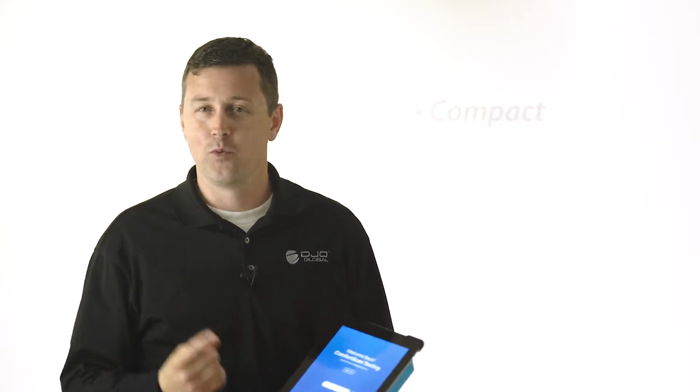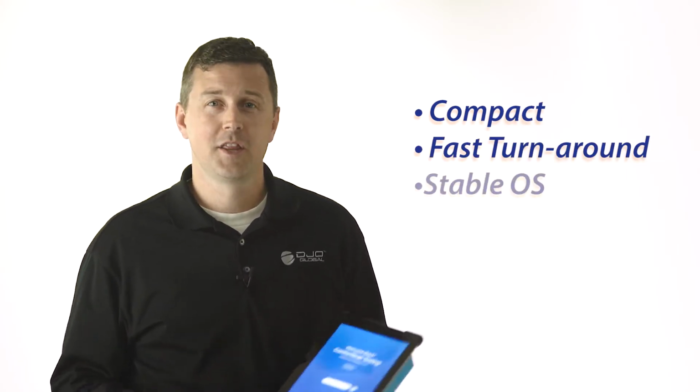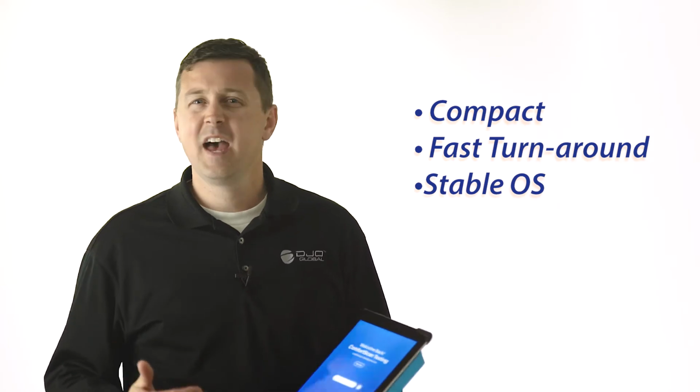Dr. Comfort's mobile scan app has many great features. One, it's compact. Two, you'll have a faster turnaround time. Three, it's on a stable operating system, and many others. So let's take a look at how intuitive this app can be.